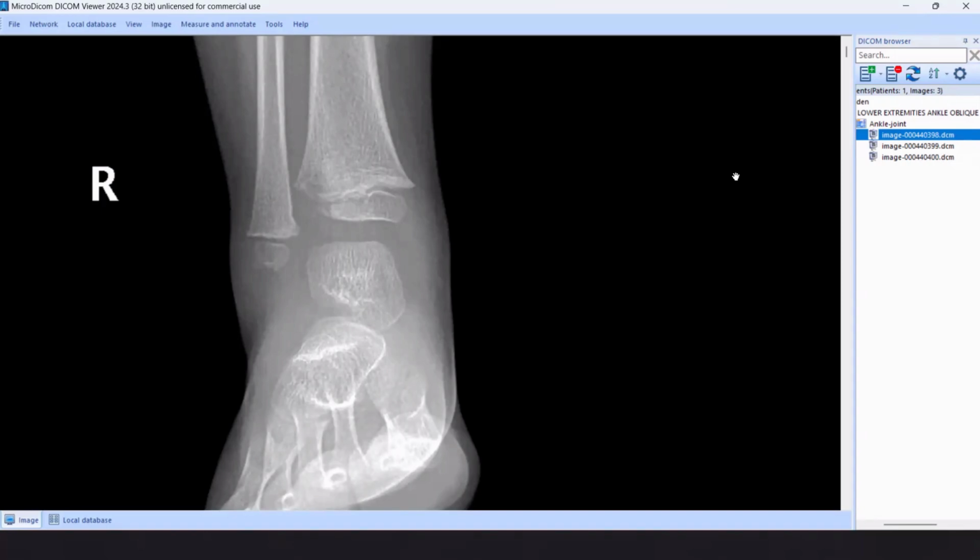A fracture. Where is a fracture? There's a fracture there in the physis of the distal tibia. This should be Salter-Harris type 1. We don't have any trauma. There's no trauma. We have pain and swelling. There's soft tissue swelling.